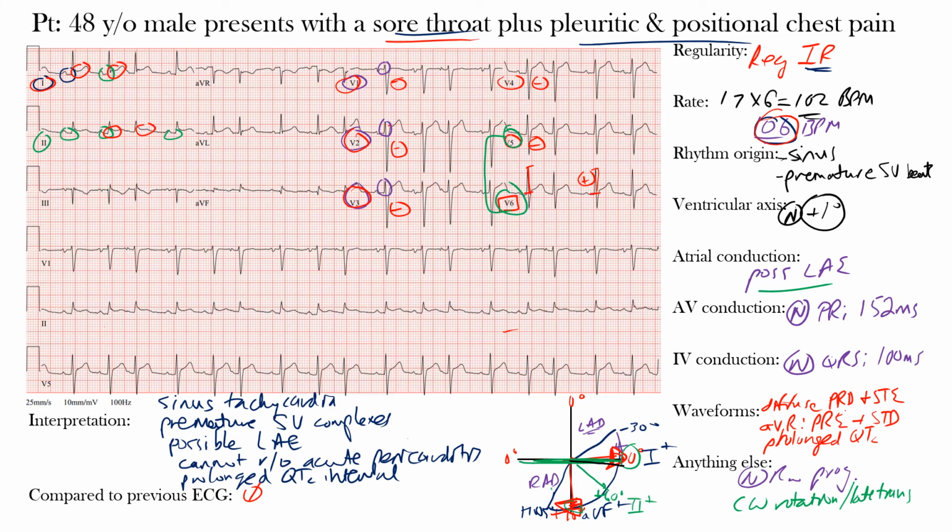Another common thing we can see with acute pericarditis is sinus tachycardia. It's that sinus tachycardia that we saw here. And just to fill that in for you, these were the premature supraventricular complexes. So sinus tachycardia is something very common that you can see with this inflammatory condition. It's inflammation of the pericardium that's causing this, and it was the patient's clinical picture as well as these ECG findings, not fully diffuse throughout, but the clinical picture helped to confirm this. Hopefully that makes sense.